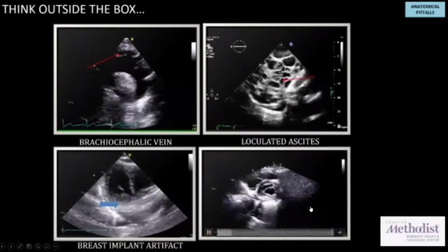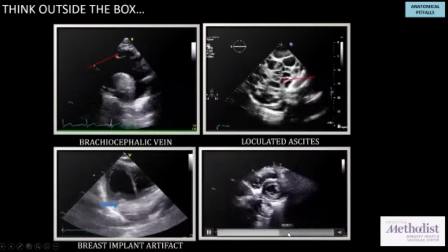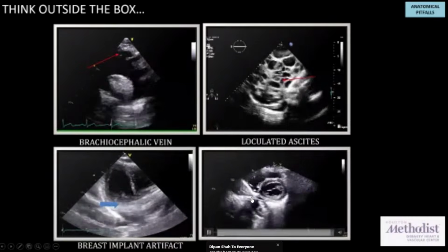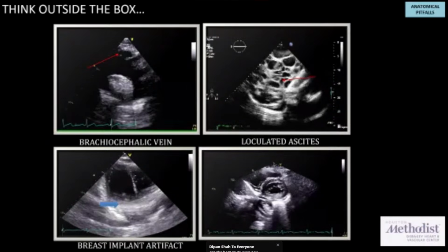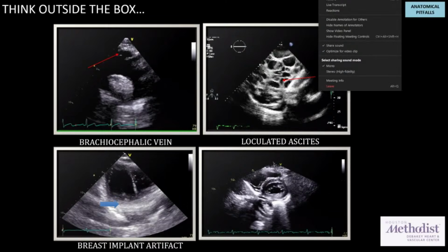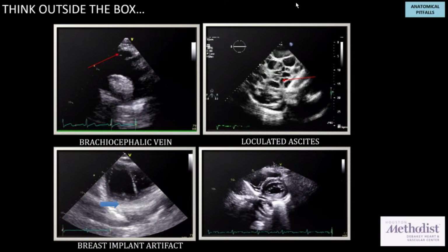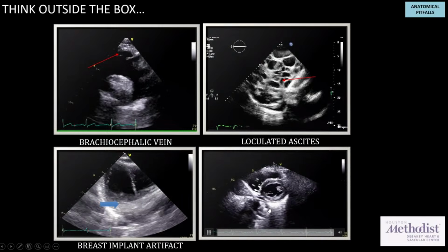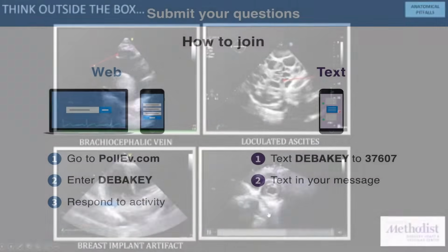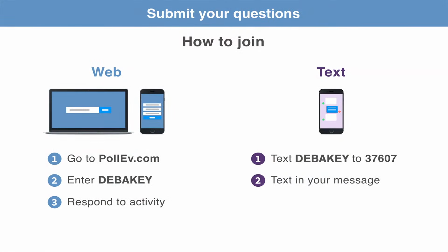And this one here is my favorite. What do you see? Large retrocardiac shadow there, retroatrial shadow. What do you think is that? That's nothing but actually a hiatal hernia. And it can be confirmed by ingestion of a carbonated beverage. And you see how it's enhancing the whole retrocardiac shadow.